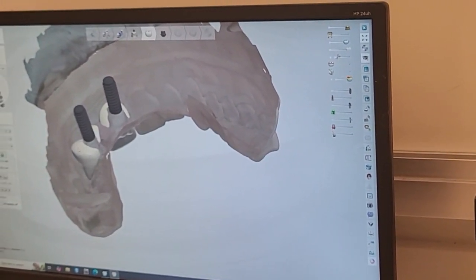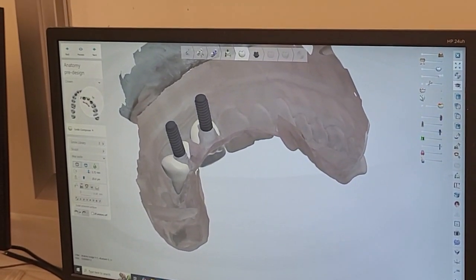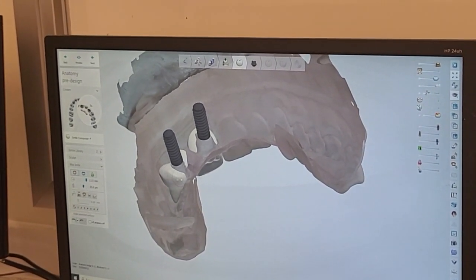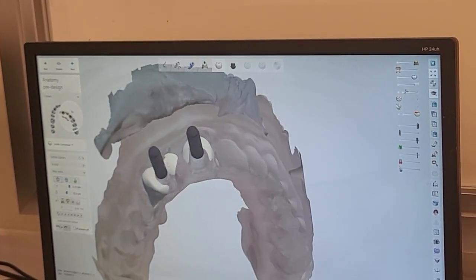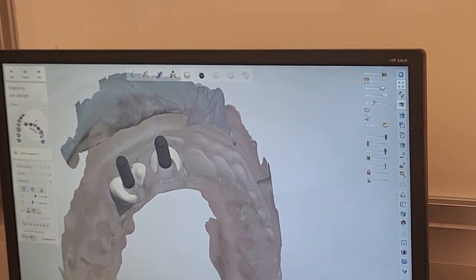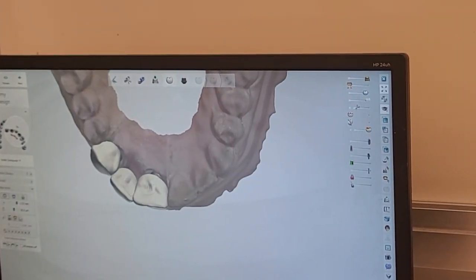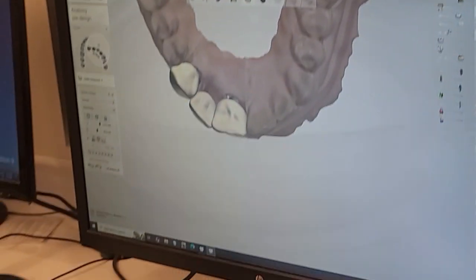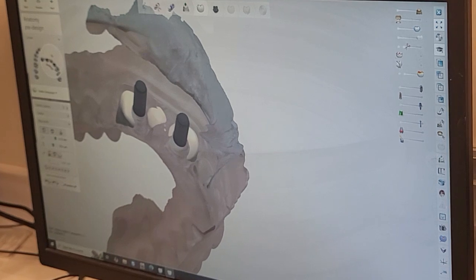So you can click sculpt on the protected surfaces, and it's going to allow you to see here. Let's say I want to add, it doesn't allow me. Or does it? Yeah, it does it. But you're going to see later on that it's going to be at a point where it's not going to allow me to do it.